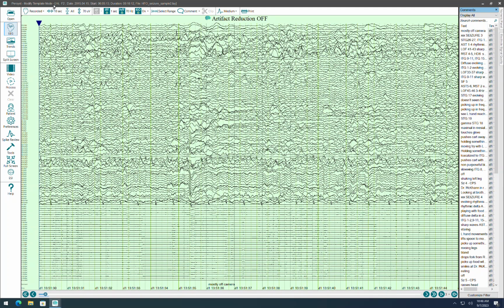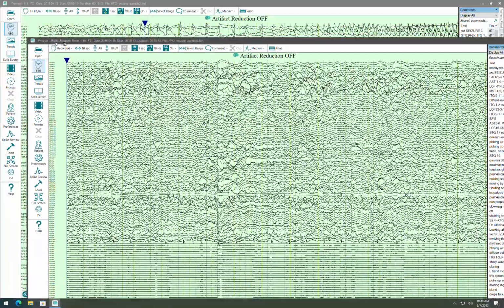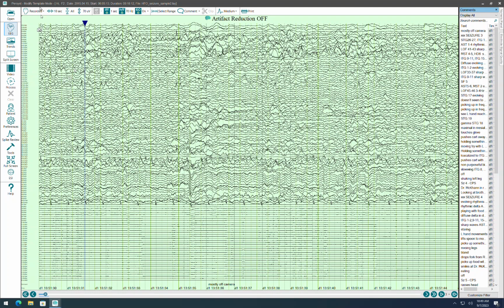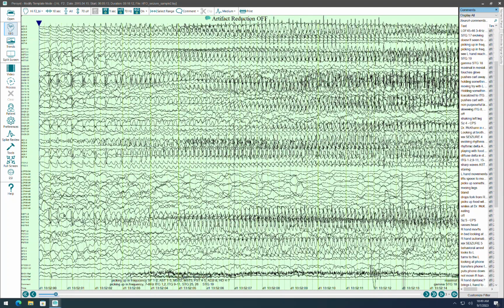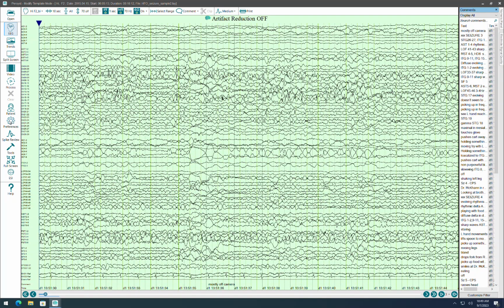Now I've opened an editing instance of Persyst. It shows up as a separate window, and in the upper left, it says Modify Template Mode. Again, we've got this bipolar montage we've created for this particular recording. I'm just paging around a little bit. We'll stop here. Now I'm going to build some trends, and to do that, I want to split the screen.